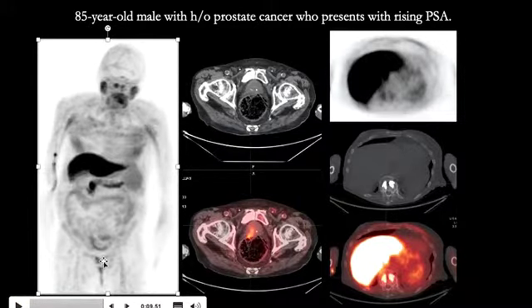There is a focus in the pelvis, which is localized here in the right side of the prostate, with a suggestion of extension towards the rectum. And so, for local staging, this patient needs an MRI of the pelvis to further evaluate this focus. The interesting finding is seen right here in one of the vertebral bodies in the abdomen. We see two foci of increased uptake.